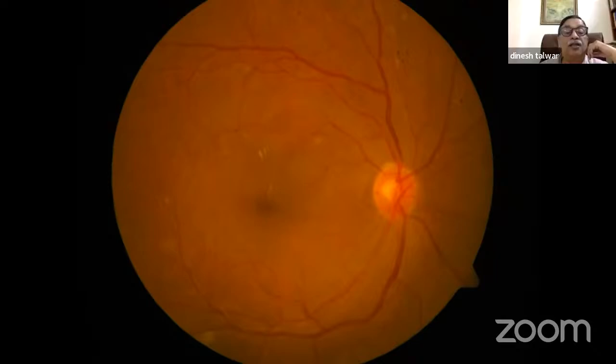Now, if you look at these points, these are more than 1000 micron from the foveal center. They're actually more than 1 disc diameter, about 1500 microns away. They're absolutely safe. A 100 micron spot cannot spread into the fovea from here. It can't cause any foveal effect. Now, this area is amenable to focal macular laser, but it is a center involving macular edema. So you can have a center involving diabetic macular edema where the origin of the leak is more than 500 microns from the foveal center, and which is then amenable to laser.